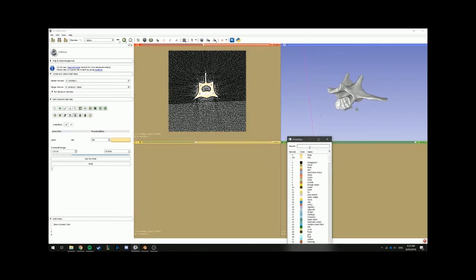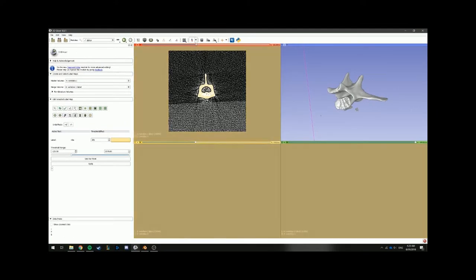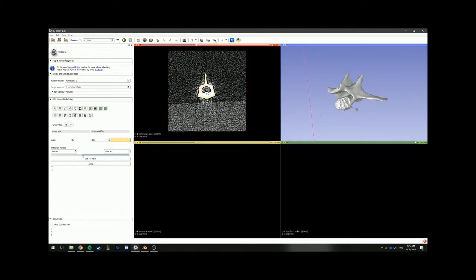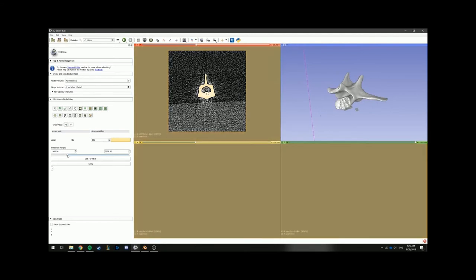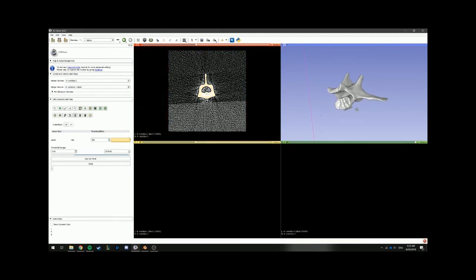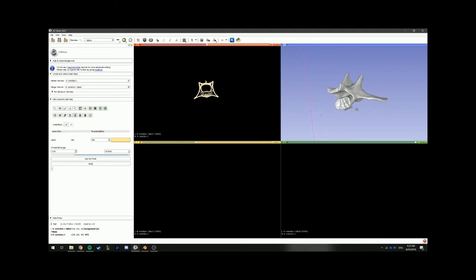what segment we want to choose from the layer itself, as you can see here, and then we can toggle here how much of the bone we actually want to use. And the farther I go to the left, the more clutter it will pick up, and some of the internals that we might not need. So if I just fine tune it to be something like that, where it at least takes in the surface of the sides, yet still has minimum inside, then that's a win for us, so we don't need to edit it as much.